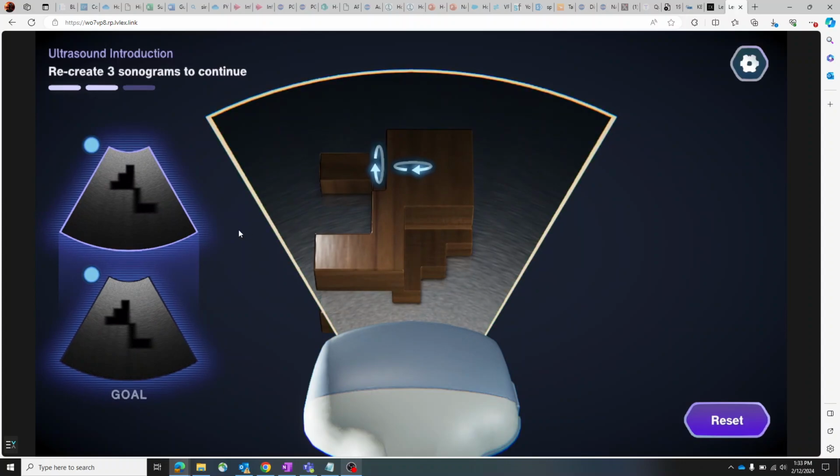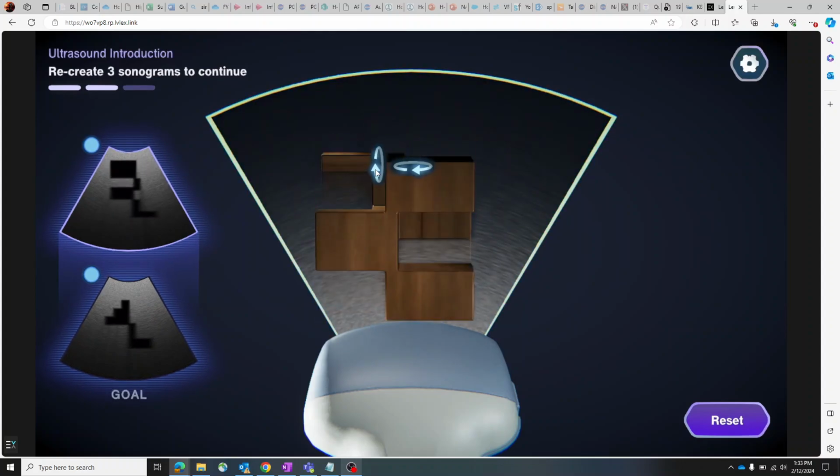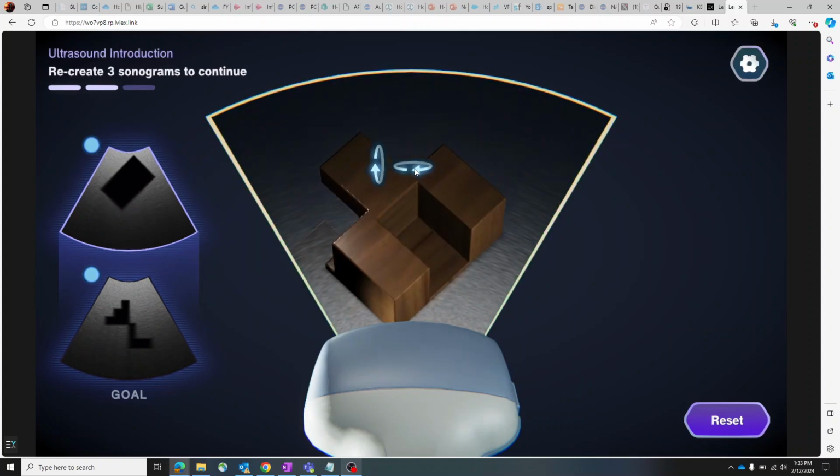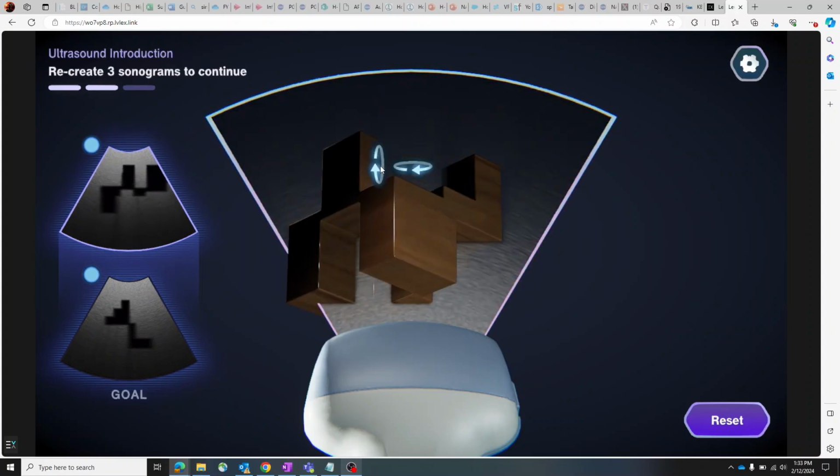And you can see the probe is going to snap to the surface. And then you see here, Theo has grabbed the green sphere, which allows you to adjust the probe angle. So you can translate over the skin with one motion and then adjust your angle to get a finer view as you get close to it.